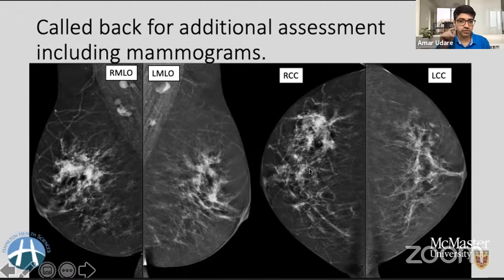So when you see this, make sure that you turn on all the image overlays and look at the exposure factors, check the kVp and check the mAs to confirm your hypothesis. Once that is confirmed, you are thinking of something hiding underneath there. So Celda has given an answer of ILC, and Celda, that is an excellent choice. That is exactly how you should approach these kinds of mammograms.